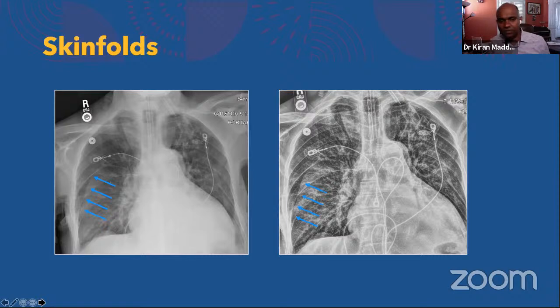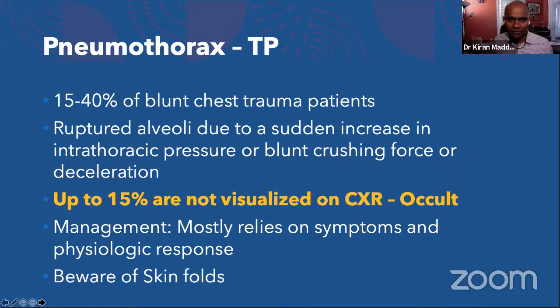Most of the patients in trauma, or in the ICUs, are lying down for a long time, and they may have a lot of lines and tubes over them. So you have to be very careful. The way the radiologist finds out is, if beyond this line or marking I still see the vascular markings of the lung parenchyma, we try not to diagnose it as pneumothorax, or we talk to you or repeat the radiograph and make sure that we are not dealing with a pneumothorax.